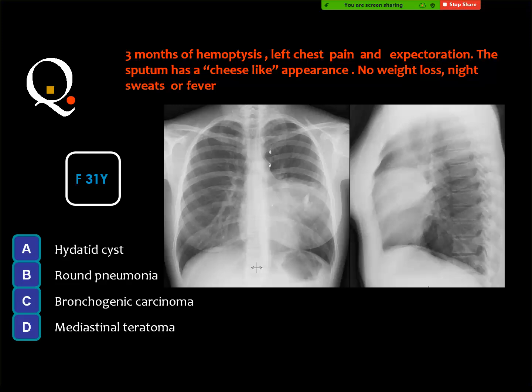No, the pleural plaques is thickening of the pleura, whether the costal, the diaphragmatic, or the mediastinal pleura. But the pleural plaques, yes, I mean.